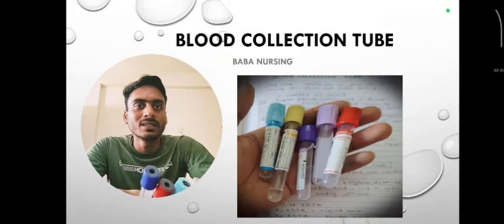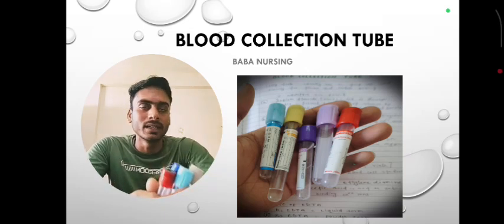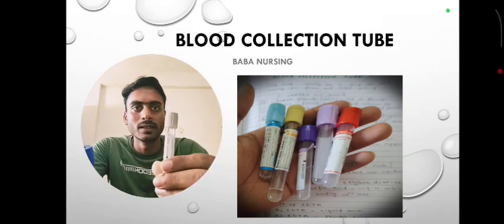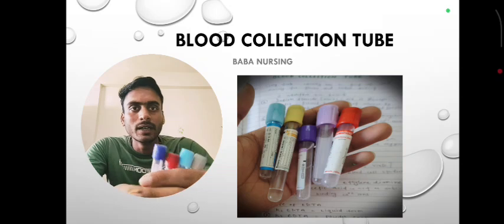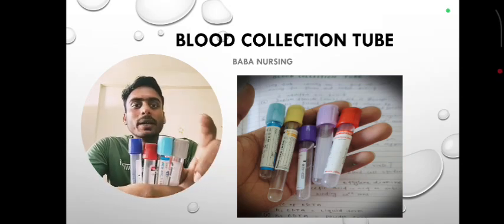So in this video we will just discuss the blood collection tube. There are different kinds of blood collection tubes. If you are going to any clinical posting, you will definitely withdraw blood and fill it in different vials, or different tubes, sorry. There are different kinds of blood collection tubes according to the color coding, each having a different purpose.